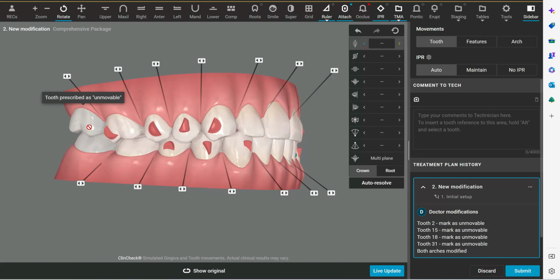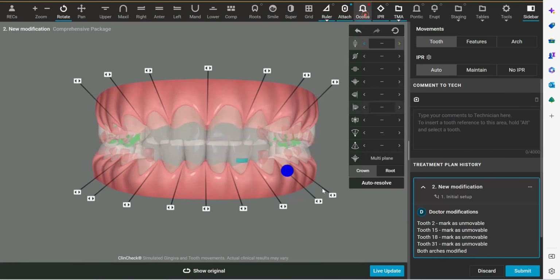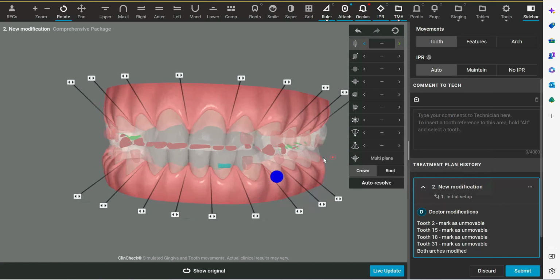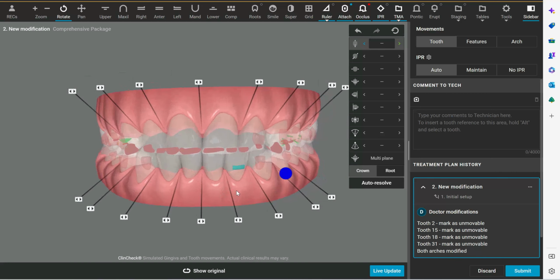So what does that do after we go ahead and close all the spaces? You can see right away that there are prematurities. So the trick I use is, again, getting rid of that shift unless you intend it to be there. And it's kind of deceptive. It can fool you because you can't really see it. You don't even notice it. And then you go ahead and approve the treatment plan, and you end up with a lot of problems with anterior premature contacts and posterior open bite issues.